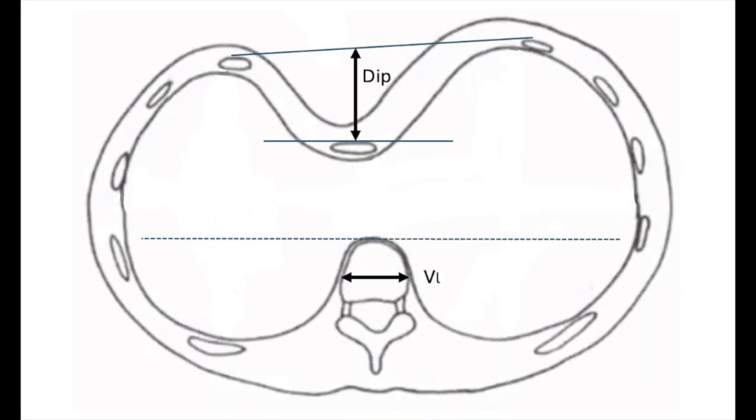And the final index of severity that we're going to take is actually the one used at the Mayo Clinic in Phoenix and the one most favored by their radiologist. He feels this is most significant for patients and most correlative with a person's benefit after surgery. This actually is the only one to take the severity of the dip. Now, very importantly, how do you measure the dip?